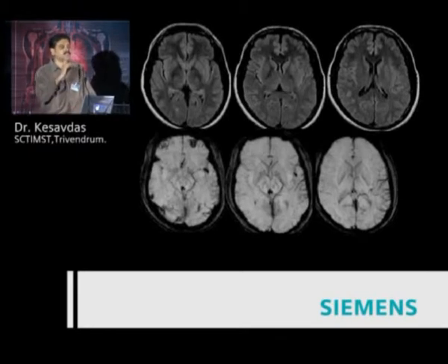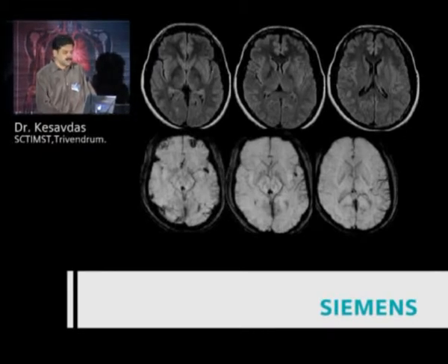This is a case which came after 3 hours. So the patient directly went into the MR and we did the study. Any lesions here? This was the FLAIR sequence. This was the susceptibility weighted. Are you picking up any findings? Actually, we saw a very important finding here. Yeah, the dense MCA. So the dense MCA, which Vijay talked about, is already there in the susceptibility weighted imaging.